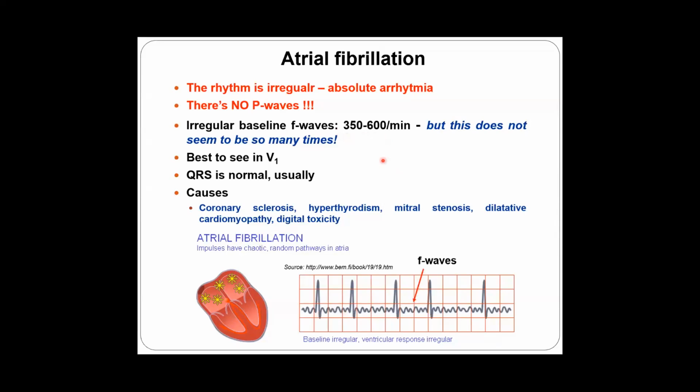However, a small noise filter is applied to the ECG to filter out movement or electric noise. This is why sometimes the fibrillation disappears from the baseline and you see a straight baseline, but you do have arrhythmia absoluta, irregularity, and there is no P wave.